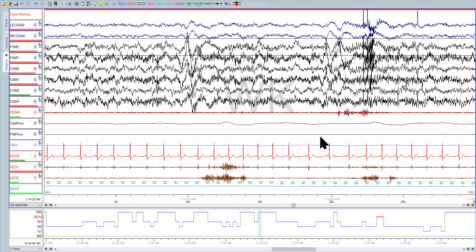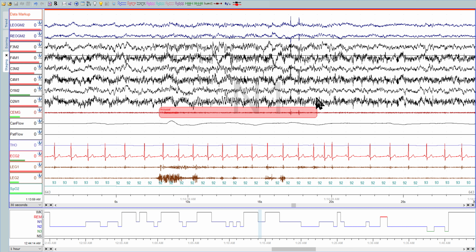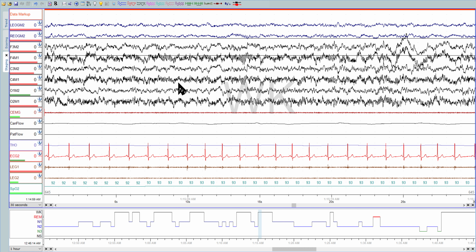So you have more stage 2 in this epoch than you do stage 1. So we'll call it 2. And then 1.